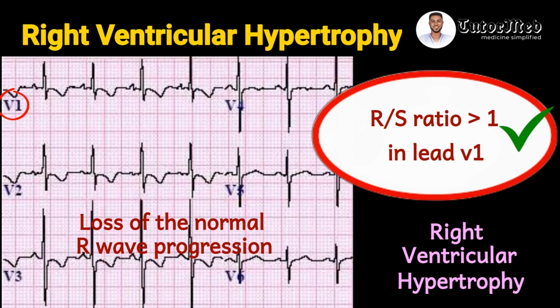Now, in the event that both ventricles have become hypertrophied, you will see a combination of the features we discussed. You see features of right ventricular hypertrophy evidenced by R to S ratio more than 1, and you see that the Sokolow-Lyon method or criteria would also be more than 35 millimeters. If you have that, then you can comfortably diagnose a biventricular hypertrophy.